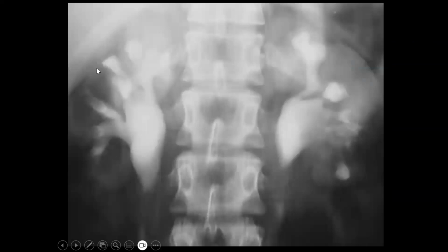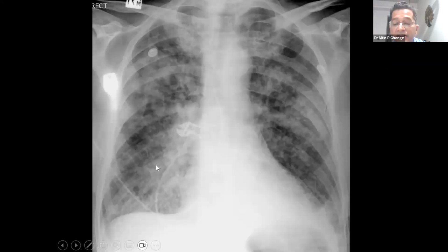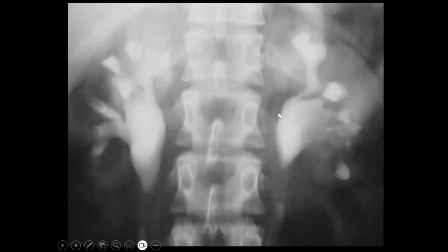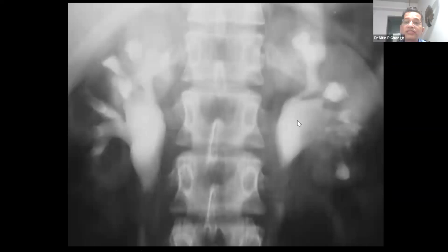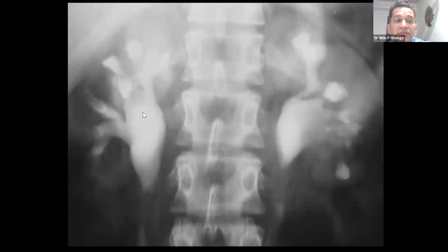This is because of, you can see the peripheral nephrogram is kind of eaten up, and this is an abnormal nephrogram on both sides because of the cystic renal disease. So otherwise the pelvic system is not dilated and shows normal appearance of the calyceal system.